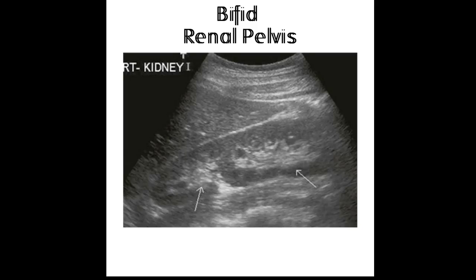So here's an example of a renal bifid pelvis. We've got a kidney that looks just a little bit larger. And what's really prominent on these renal bifid pelvises is that we have this prominent column of cortex that cuts through the middle. So here's one upper pole collecting system, and then we have the lower pole collecting system divided by that renal cortex.